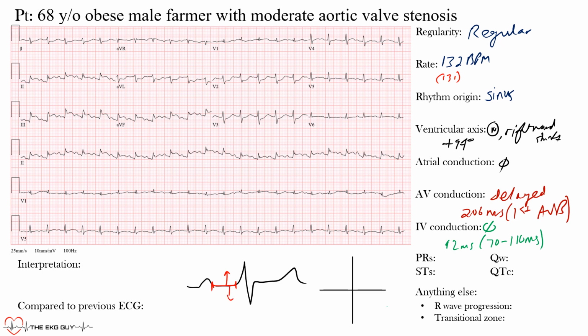If you look here, we're looking at this area. It's not really so much. You can see how it goes like that, and that may be a motion artifact on the limb leads, whereas you can see V1 is pretty flat as the patient is on their chest. So I wouldn't say that there is any PR elevation or depression that's significant or alarming here.